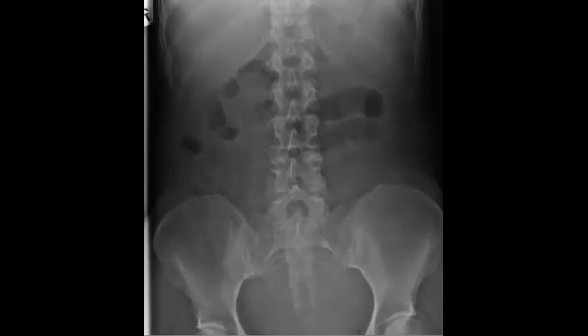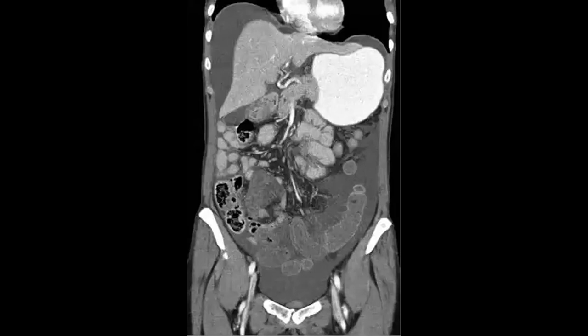But before we go to the differential, let me show you something in the CT. Probably you don't solve the complaint of the patient, so I think you will go to the CT. So CT abdomen pelvis, and the clinician sent you the request again to find the cause of the severe abdominal pain of this lady. This is the coronal image, with both oral and IV contrast, and let's try to find the cause.